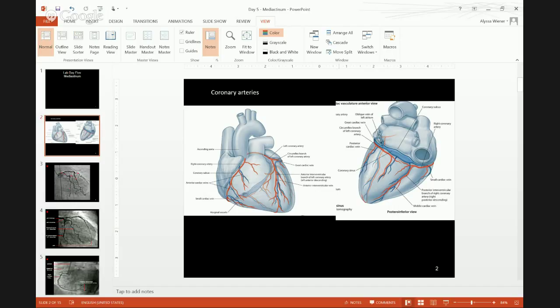Then we have all these things plugging into the left atrium, so we know those have to be the pulmonary veins. And this kind of 3D angiogram illustrates a nice point, that we have the pulmonary veins that are inferior to the pulmonary arteries, okay? Pulmonary trunk here. And then coming up off of all of that is the aorta. So we've identified all the things, and then we can say which of the structures is carrying deoxygenated blood. It's not the aorta, it's not the pulmonary veins. We're looking at 2, which is the pulmonary arteries. But this is a question that's asking you to integrate a lot of information, to identify different structures, and then combine that with your knowledge of the oxygenation state of blood.